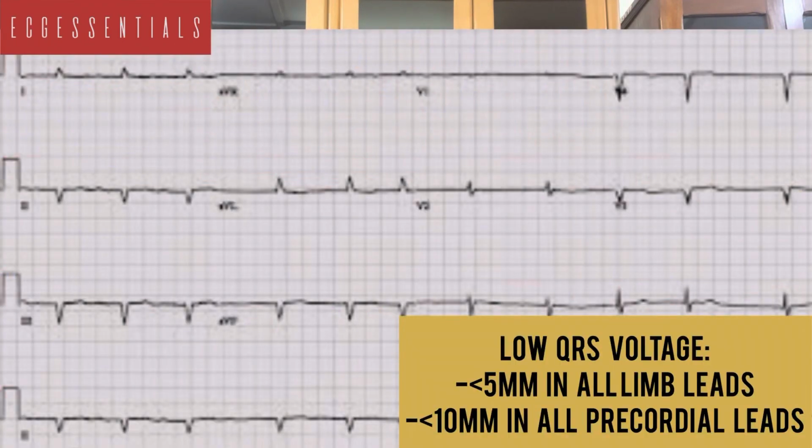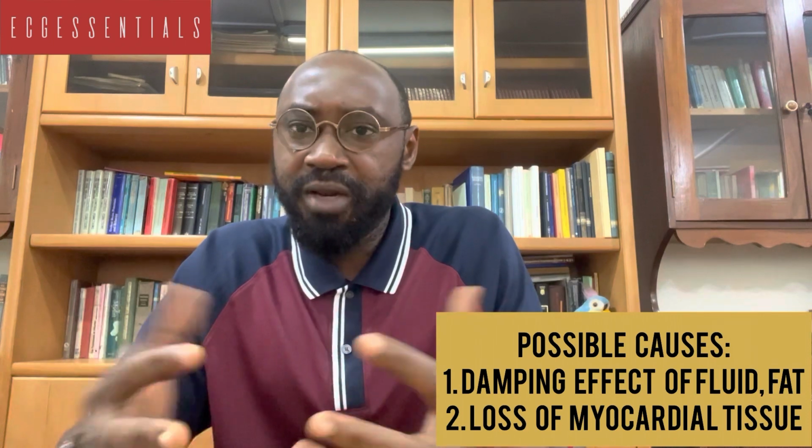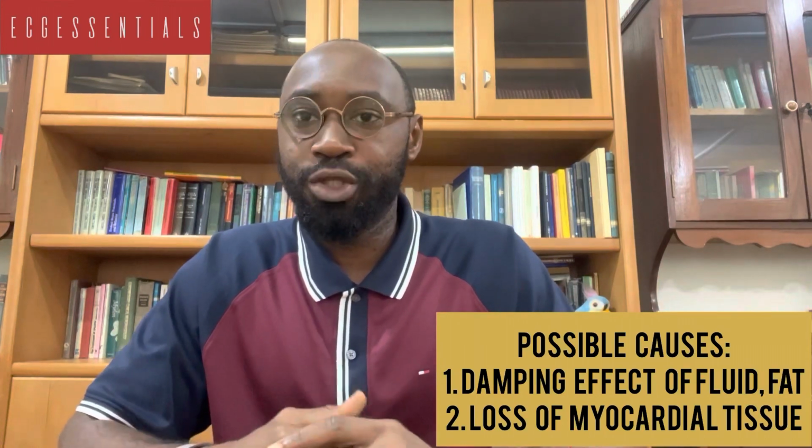But once we see that the voltages are increased, then we may be interested in looking out for the possibility of, say, left ventricular hypertrophy. On the other hand, the QRS voltages may be low, and this is defined as voltages less than 5 millimeters in all of the limb leads, or less than 10 millimeters in all the precordial leads. If this is the case, then the possibility is usually a damping effect from, say, fluid or fat that has become interposed between the recording electrodes and the heart tissue, right?